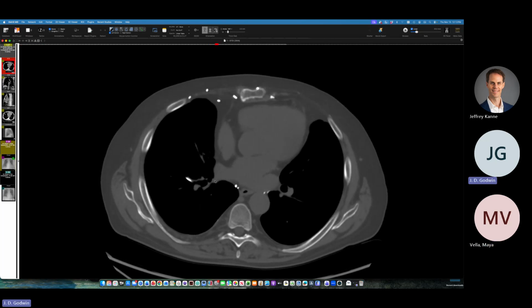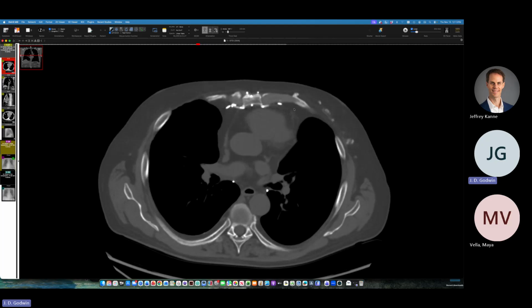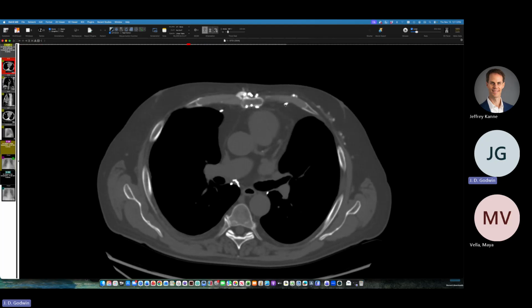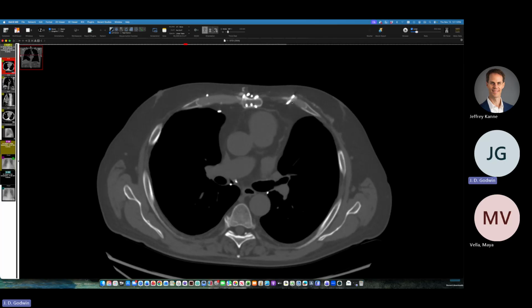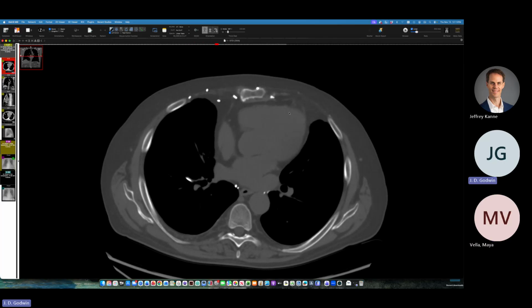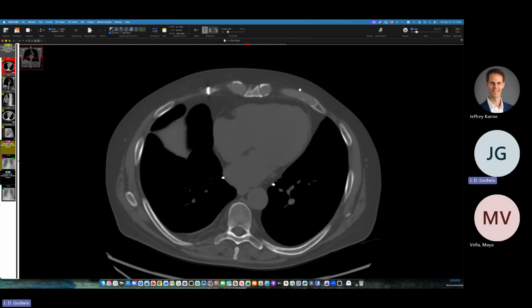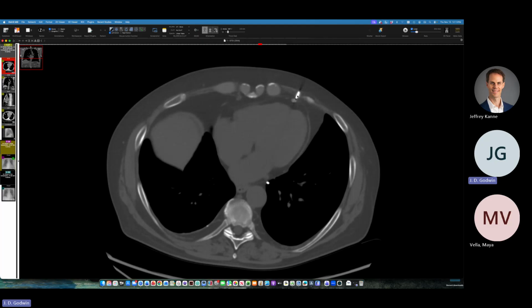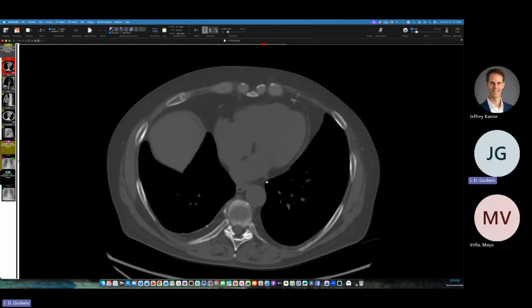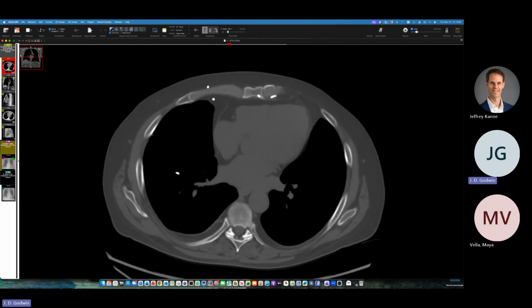And the hypothesis is that these are the wires up here anteriorly, that one of those left-sided wires, since the left side is the deficient side, you can see the wire going through the sternal cartilage, the rib cartilage here, and it ends up being very close to the right ventricle here. So it would be fairly easy for this wire here to just poke into the right ventricle and then from there embolize to the pulmonary artery. So that's the hypothesis of how this got there.